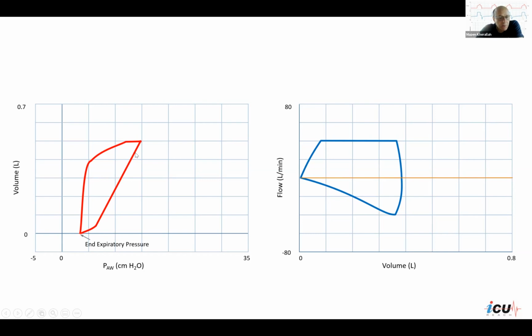increases the volume. And then we reach a point where the pressure doesn't go higher than this point. This is the peak inspiratory pressure or the peak airway pressure, PIP. And this is the pressure required to overcome both the airway resistance and the lung elastance. At this level here, you're looking at the tidal volume. The tidal volume is in this area here.